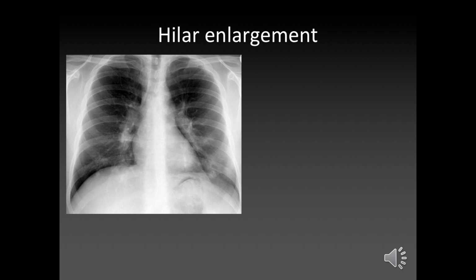So in terms of hilum enlargement, it's very difficult to actually see it. A lot of people, myself included, will probably look at this X-ray and think that it's actually normal, because it's so difficult to actually know what a normal hilum is. It's only when you've looked at a lot of X-rays that you'll see that. You'll often see it in clinical practice when the consultant asks you, and you'll be like, well, I'm not sure, is that hilum normal? But anyway, these are enlarged.